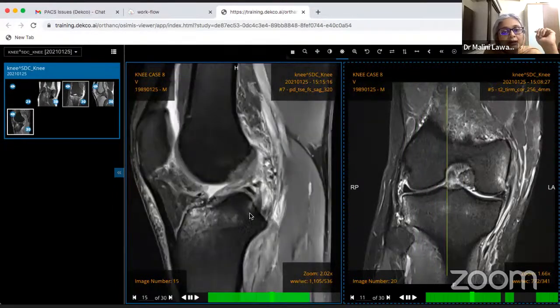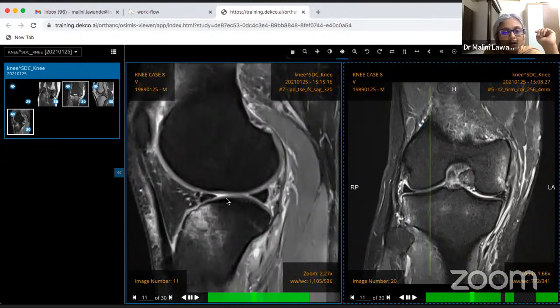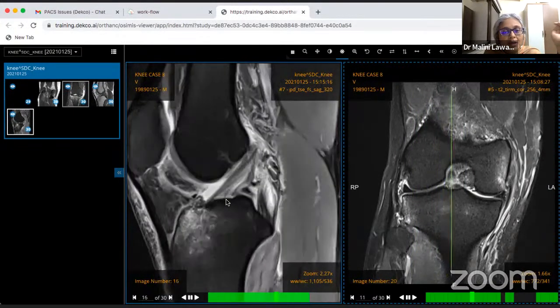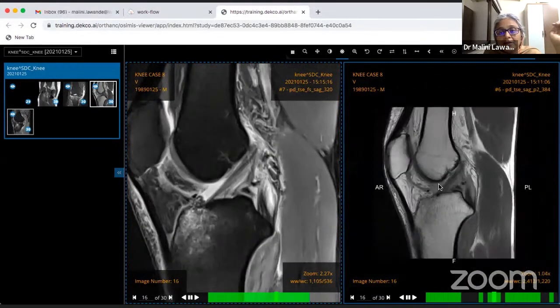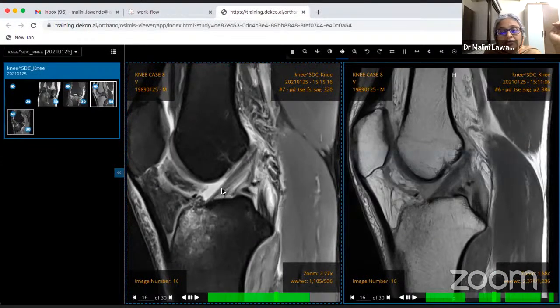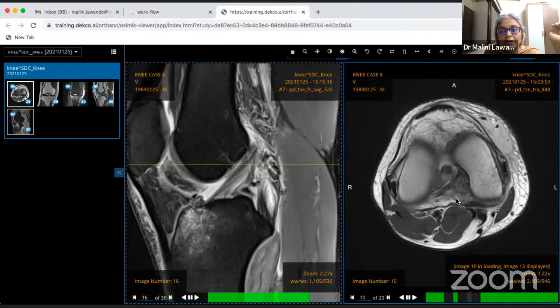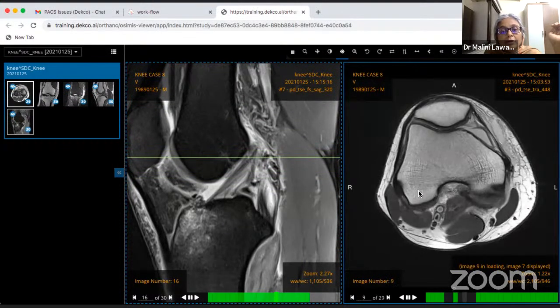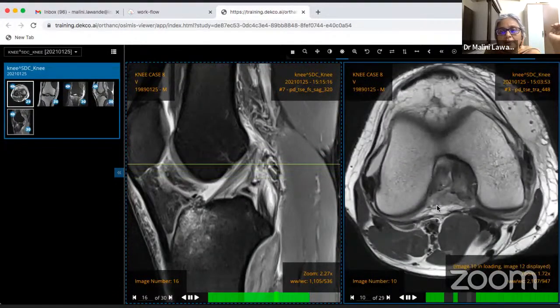So for example, here, lateral meniscus, we start looking here. Lateral meniscus looks normal. The marrow edema we already saw. This is the anterior cruciate ligament. And again, to just reaffirm, this appearance of the anterior cruciate ligament is normal, this striated appearance. Always look at the axial images. The axial images give you the clue whether the ACL femoral attachment is normal or not, because this kind of striated appearance can still be normal. It could be a low-grade injury.